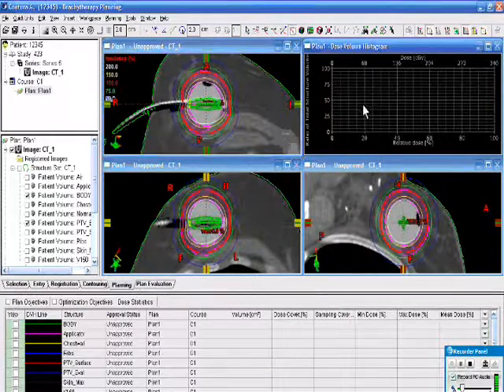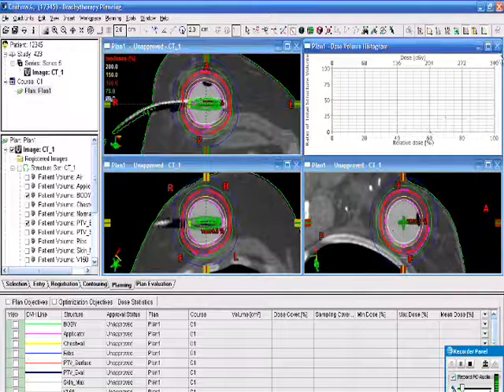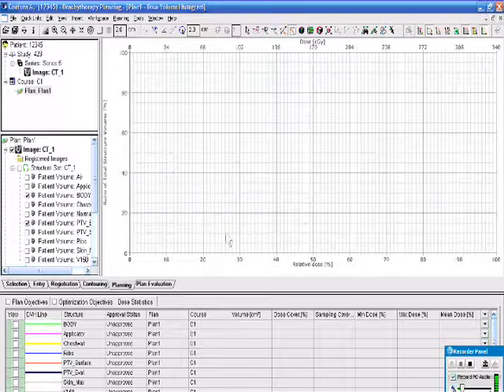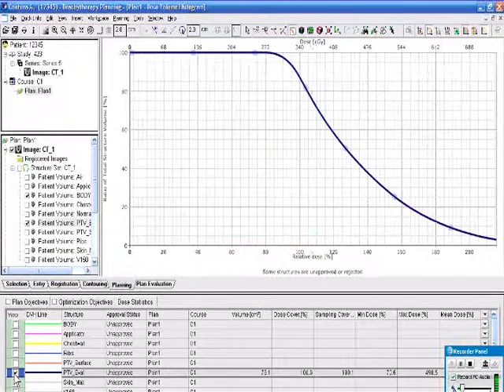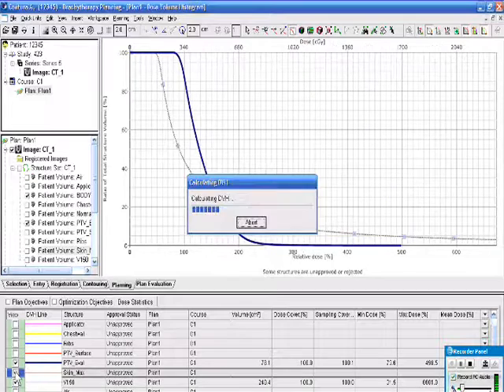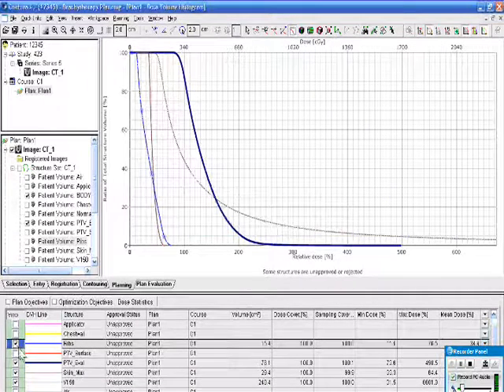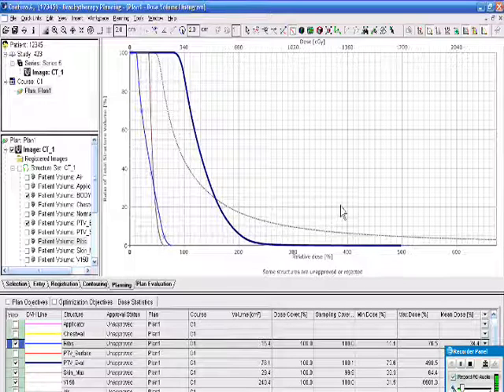And by default, it will calculate the 3D dose for that. And I'm going to make some changes to this. I like to show it on a white background. When I'm really looking carefully at it, I like to take it full screen. And then we'll decide which of the structures we want to have DVHs for. Certainly the PTV eval. In this case, we'll take the V150 also, and the skin max, and the ribs. And those are all the structures.